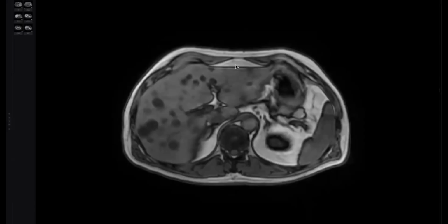Look at the periphery. This is the Indian ink sign. It's very black, very black. Do you remember when you were kids, Tom and Jerry and Mickey Mouse? You feel like this is not the true image; this is my opinion.